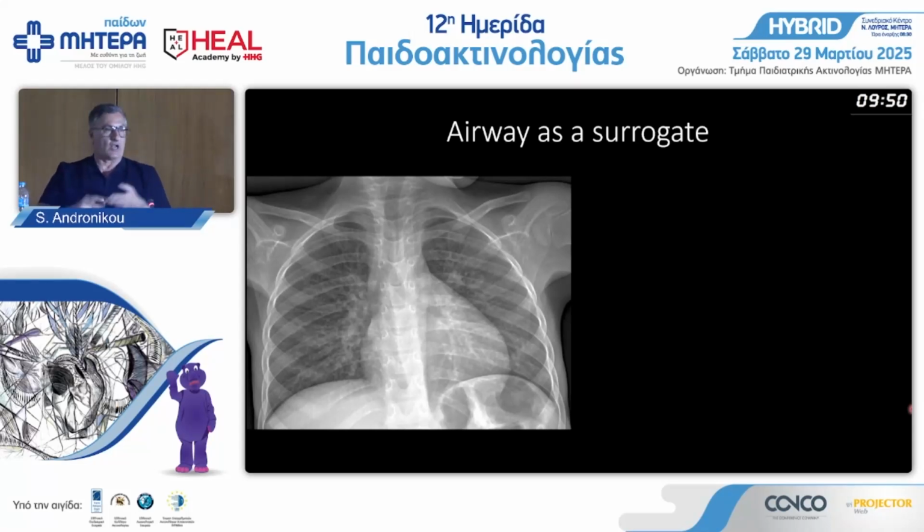Okay. The last thing and most important thing for me to give you as advice is the airway is very soft in kids compared to adults, and lymphadenopathy from TB compresses the airway. And I'm telling you, the airway is a surrogate of the surrogate. You use that as a negative thought. I don't see the lymph nodes, but because the airway is compressed, they may have lymph nodes. I don't know it's TB, but because they have lymphadenopathy, it's TB. So it's 2 steps, but they're very important steps.